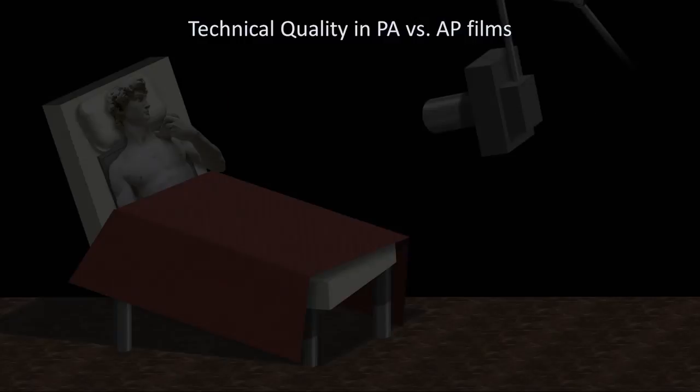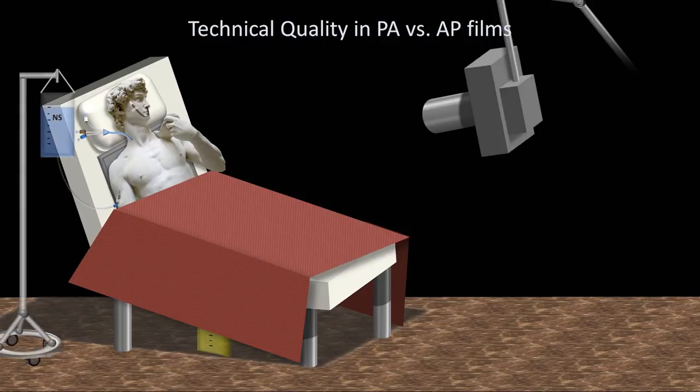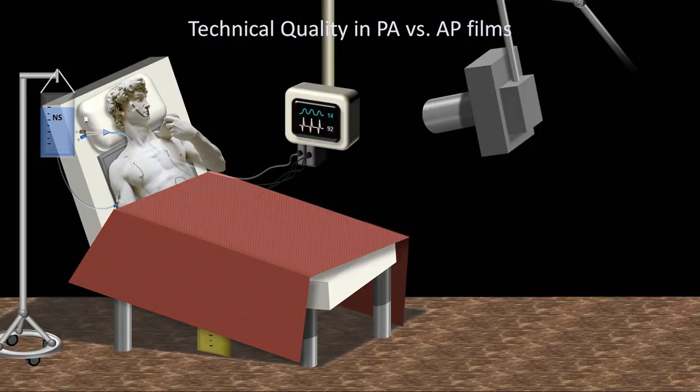In contrast, the AP film is taken of a sick patient in his or her hospital room. The patient may or may not be able to be positioned in an optimal way due to illness or immobility, and may not even be cooperative. There may be lines and tubes that the radiology technician needs to work around, maybe an attached IV pole or overlying telemetry leads. There may not be enough room for the X-ray machine to be properly spaced and positioned. Overall, AP films are taken in an uncontrolled environment, at least uncontrolled from the standpoint of the technician.